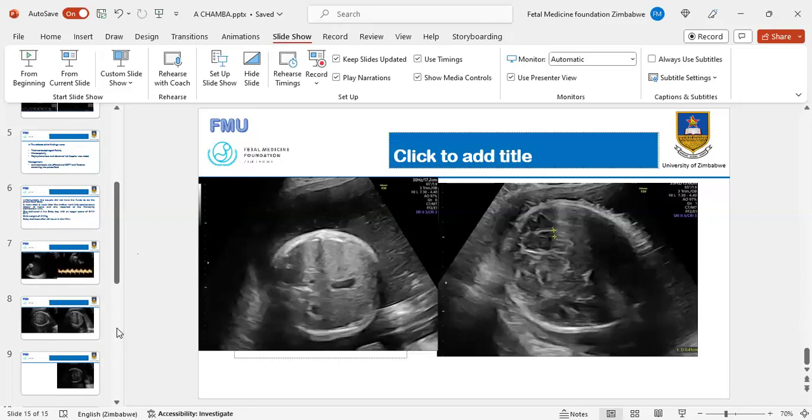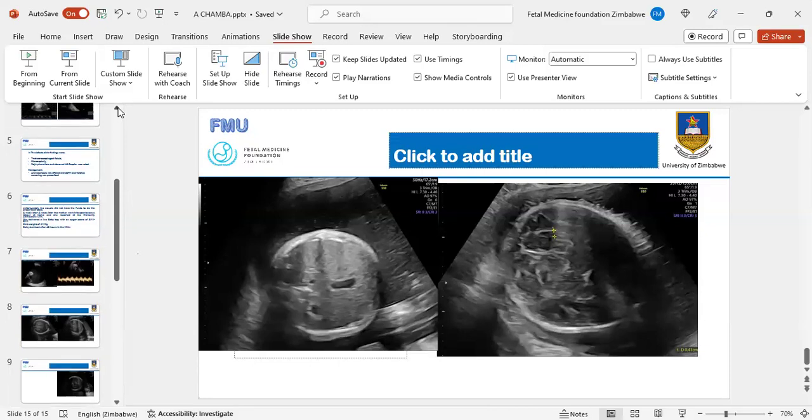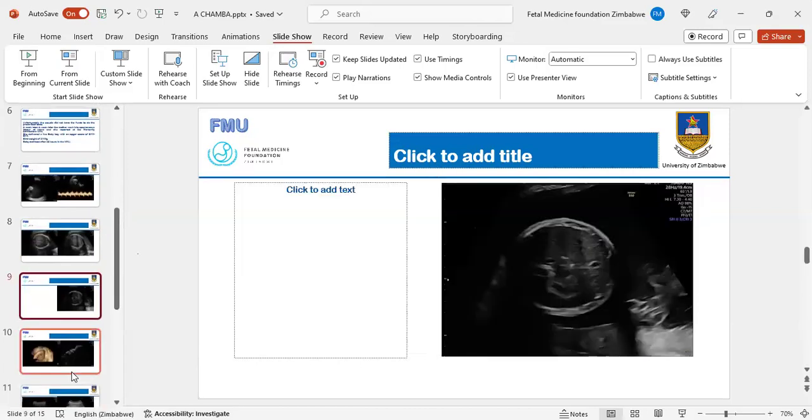For example, in this case, you saw that we lined up a number of issues we thought were going on. While the stomach was not clearly visible, you can see something that resembles a stomach, but is very tiny, from the image that Chamba is showing us. So the moment you have a defect, always remember this, FGR just becomes part of your syndromic workup.